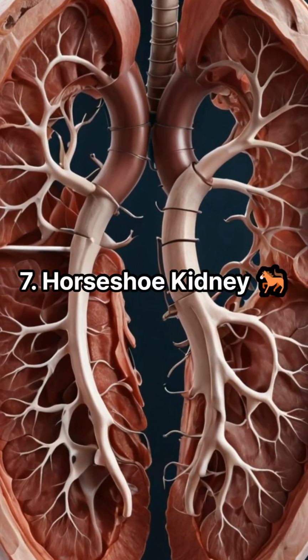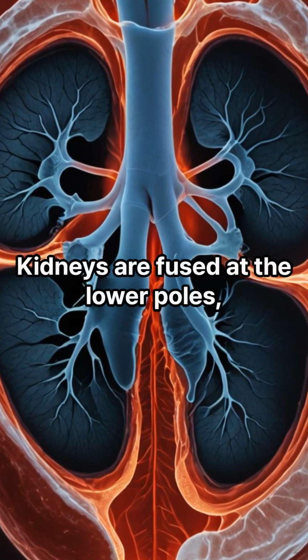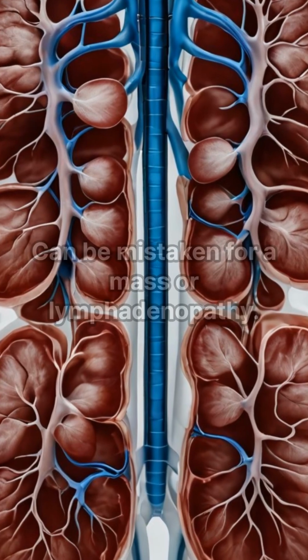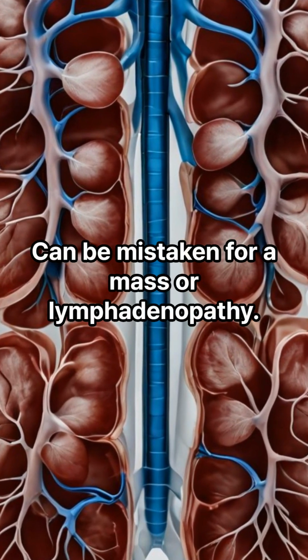7. Horseshoe kidney. What is it? Kidneys are fused at the lower poles, forming a U-shape across the midline. Can be mistaken for a mass or lymphadenopathy.